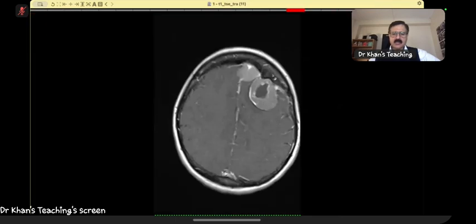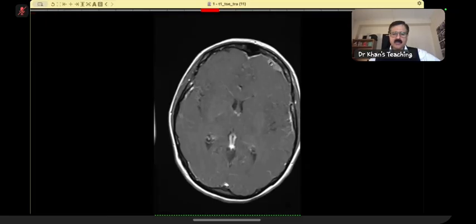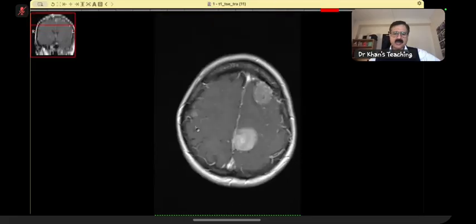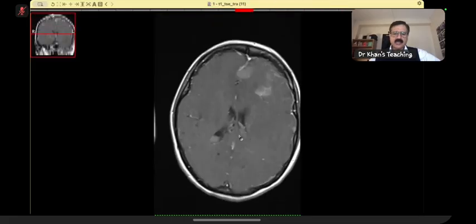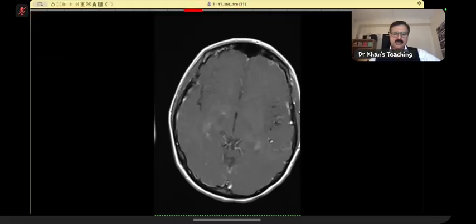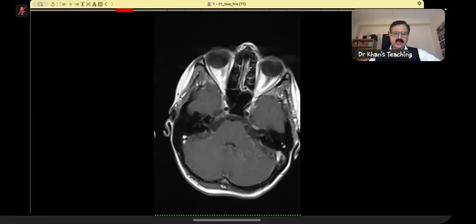And these are the ones, the hyperostosis is again there. And you remember that epidural shape? So this is that one. And there were others on the right side. Here you are. And then this is the intraventricular meningioma. The key thing is actually you were doing very well. I thought that you will.